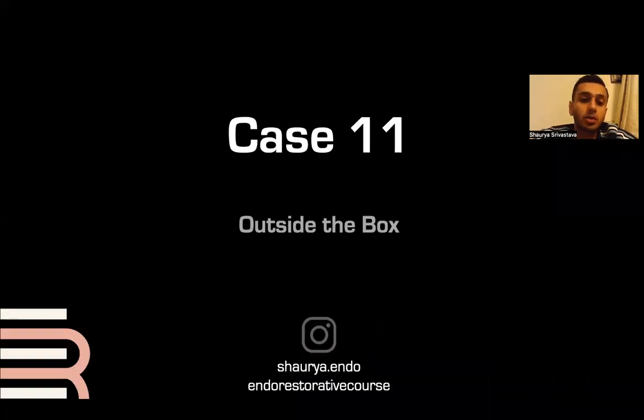Now, case 11, outside the box thinking. These are some things that are not in the guidelines, but sometimes you have to think outside the box. And I'm lucky that I have a CBCT at my disposal. It might not be possible for everybody, but this is some ways that I use a CBCT for basically making my life much easier in very complex and challenging cases.